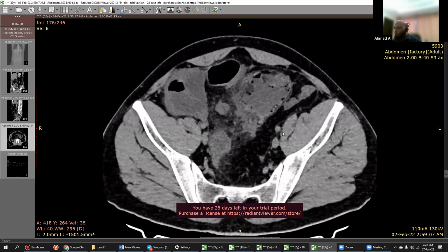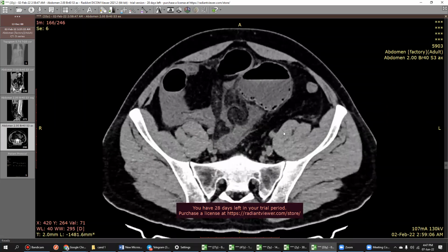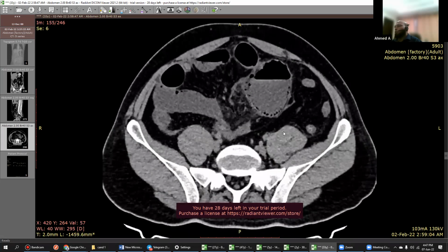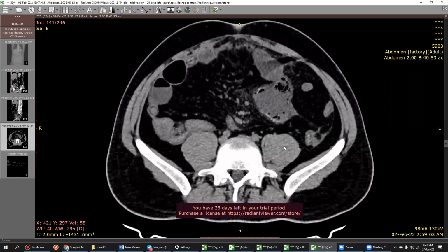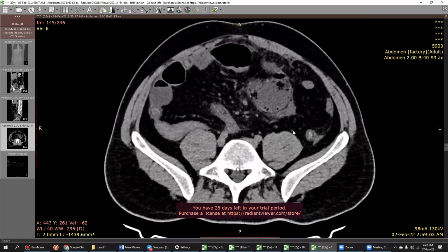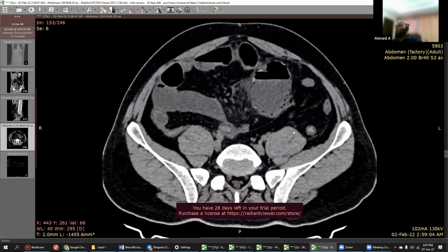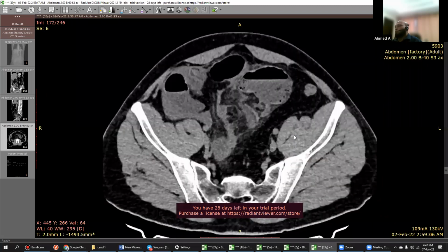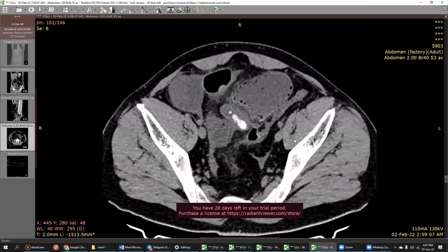So in that case, what would you do? If it is a focal area of hemorrhage, how would you know it's a hemorrhage? So in that case, I need to repeat the contrast with arterial phase imaging to have a look and confirm. No, you can measure the density, right, for the first thing. In the first instance, we can measure the density and see. So what is the density? The density looks like to be calcification.